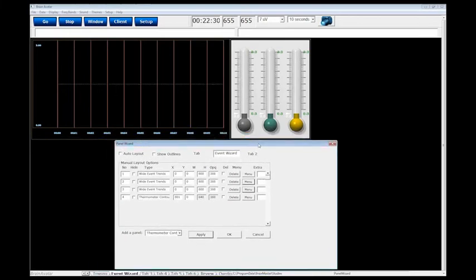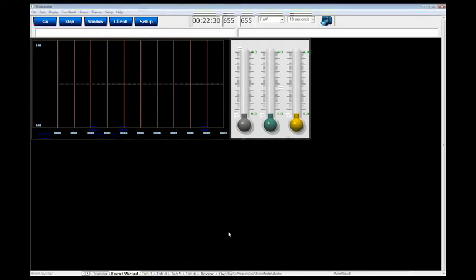So, now one of the things you're going to see right here is a bunch of white area that's blank right here. What we have built into the new software is the ability to name events, and by naming events, you're going to actually see that information displayed down right here. So why don't I do that real quick by hitting apply, hitting OK, and now we're going to go back to the event wizard one more time for today by clicking the setup button.